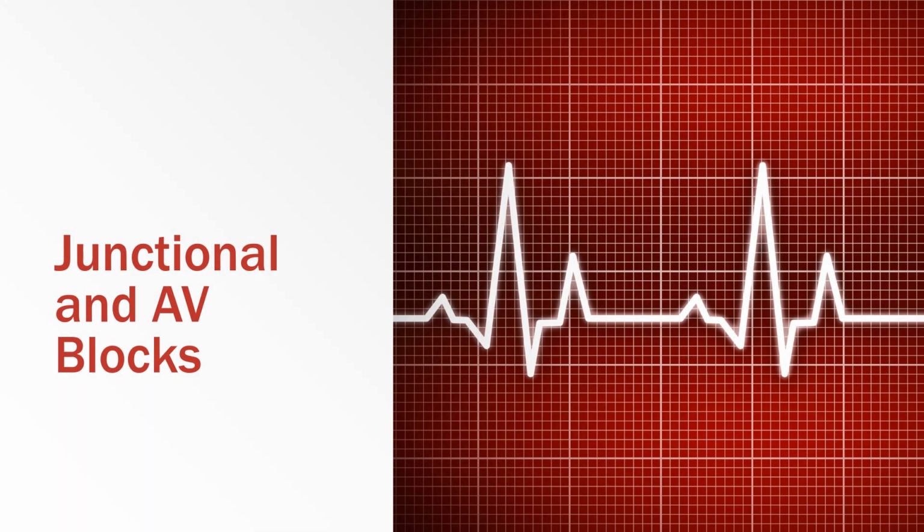Hello everyone. Today we're going to talk about junctional rhythms and AV blocks.